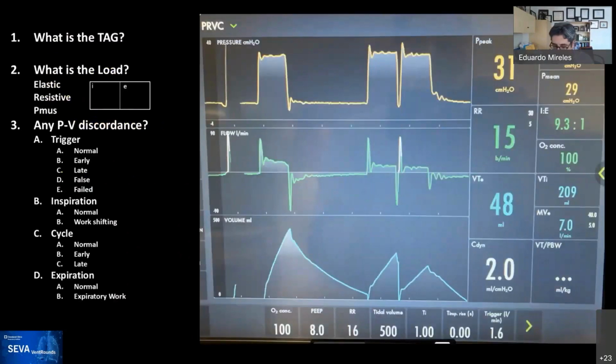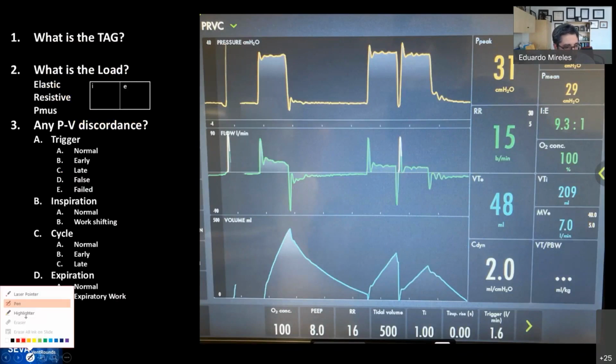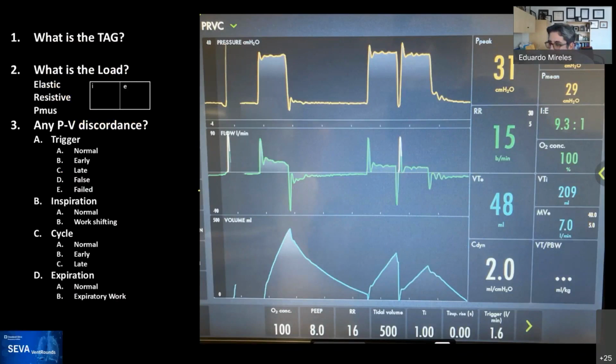As the title said, this is tough. So do we have anybody of our fellows that wants to read this waveform? And for those that are asking to annotate the image, we respectfully declined, because you would start putting lines on our screen. It's not lack of love. Any of our fellows?